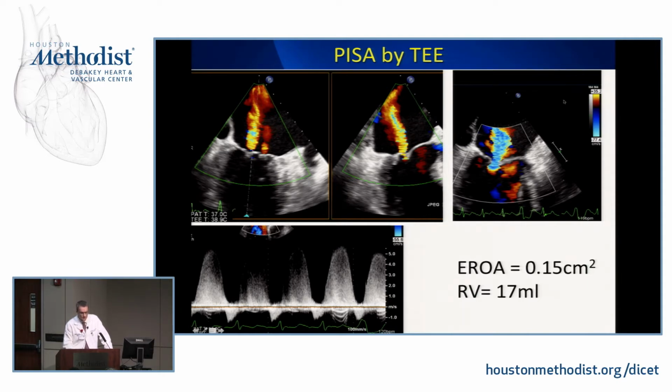The surface you're taking has to correspond to the velocity that you're determining based on your baseline shift. This is pretty small, but where the blue-yellow interface occurs is where the velocity changes. That's the velocity you plug into the equation, so that has to be the same place that you measure.